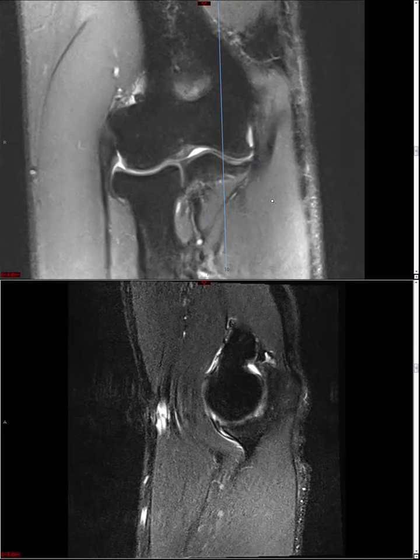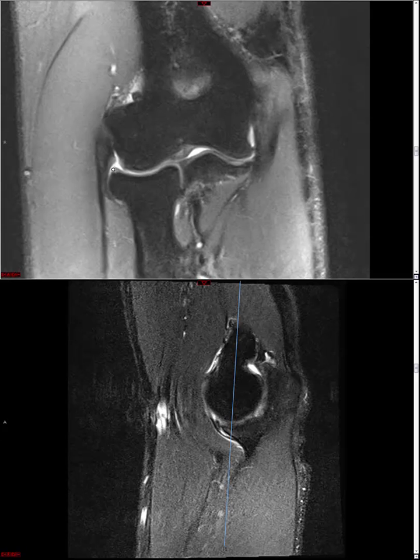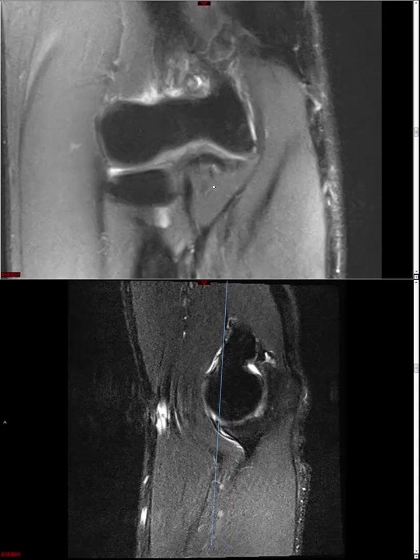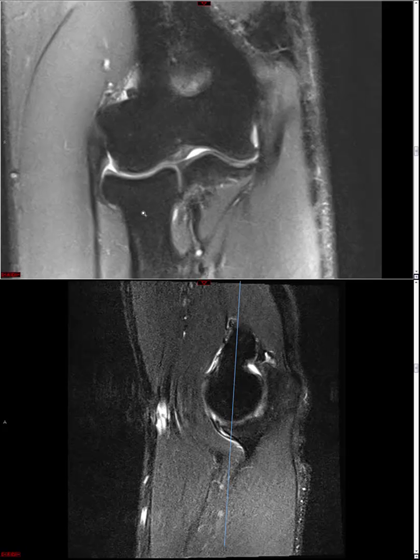And so as in other joints, the cartilage is going to be this intermediate signal that's smooth. Note that some of the black signal subjacent to the intermediate signal is also in fact cartilage as well. And we assess cartilage just like we do the cartilage in other joints in the body. So for example, if we see focal or diffuse areas of signal heterogeneity, I would argue that this radiocapitellar articular cartilage is fairly homogeneous, but if there's heterogeneity, then we would call that mild chondrosis or grade 1 chondrosis.